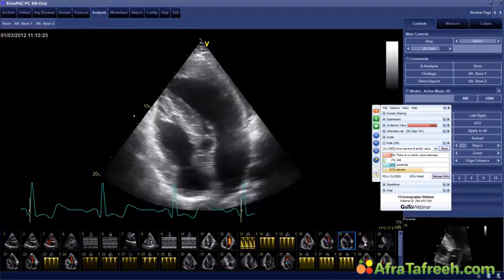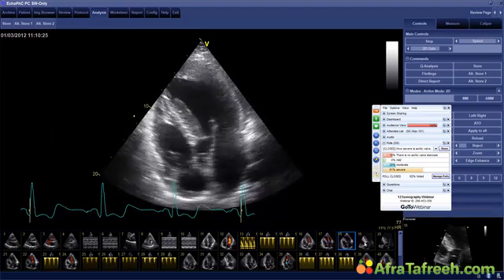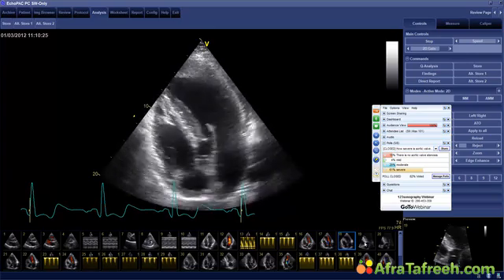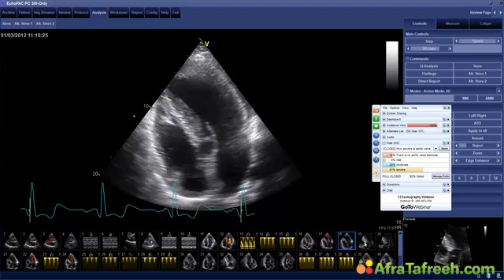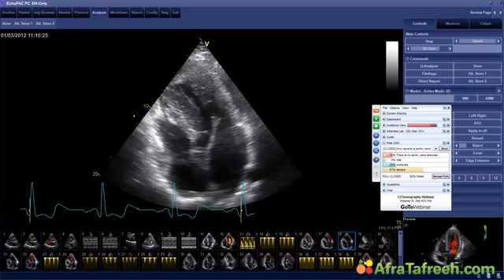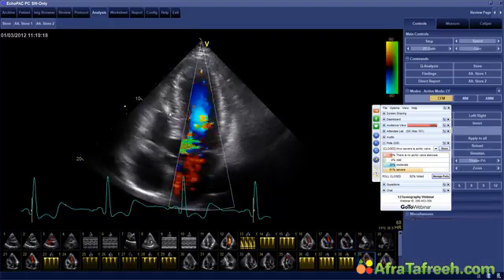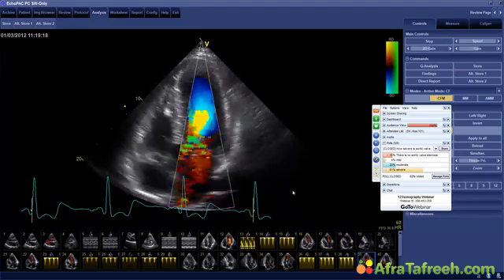And what Niels said is completely correct. There is some form of stenosis below the aortic valve. So the stenotic area is not the aortic valve, which is completely normal. It is below. This is the color Doppler study, which also answers the question of whether aortic regurgitation is present. We do have aortic regurgitation, which might be moderate.